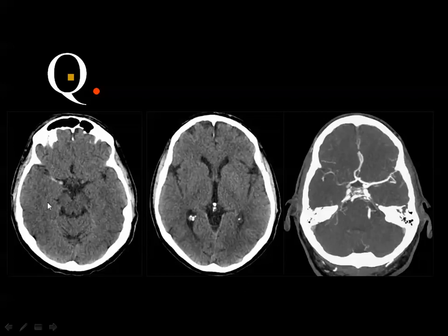And this is the middle cerebral artery, which is thrombosed. In the pre-contrast scan, you do not see a significant abnormality. This may be due to the patient tilt, but in the relatively lower section, you can see the hyperdensity of the middle cerebral artery, denoting hyperacute infarction.